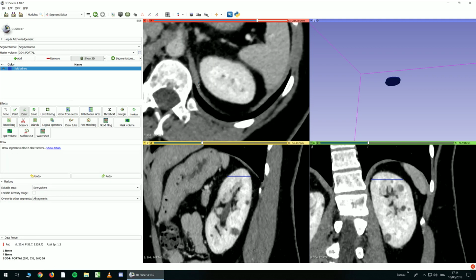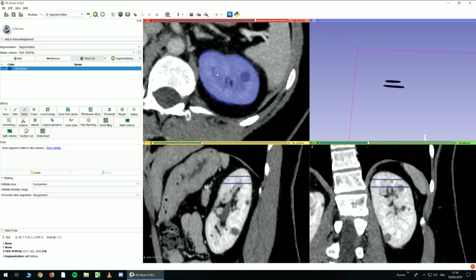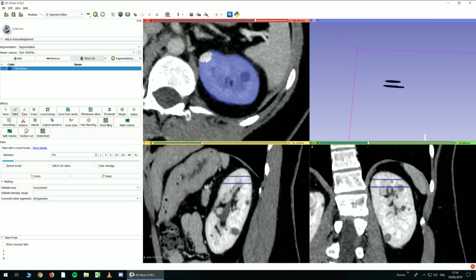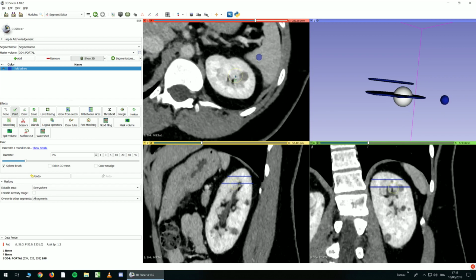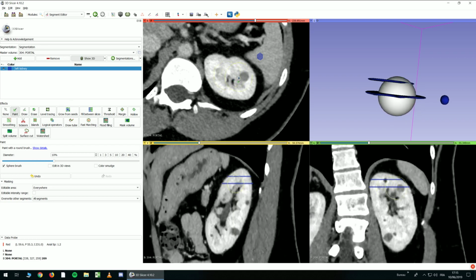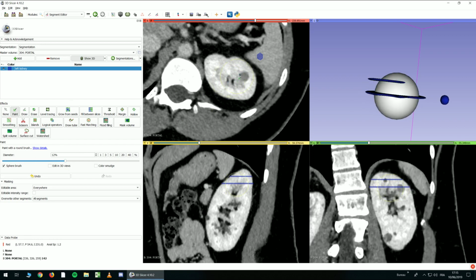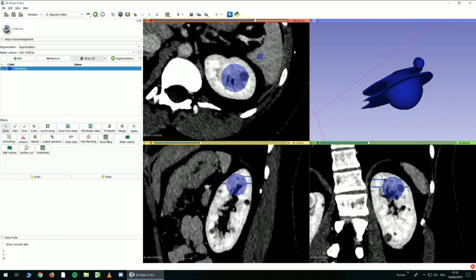Draw, it's the same thing, but you can click and right click now, and it would be the same, but just on the contour. Erase, it's for erase, of course. And what I forgot to tell you is you can use a sphere brush, and it will be a little sphere. To zoom in and out the view, you can use Control, and now you can use Shift to use a bigger or smaller brush, and you can see it will change here. So I click here, okay, and oops, and now we got this.